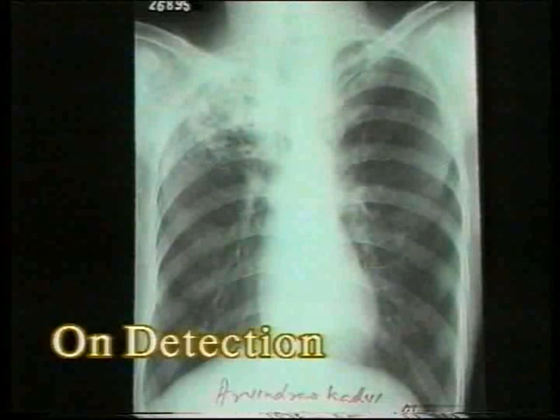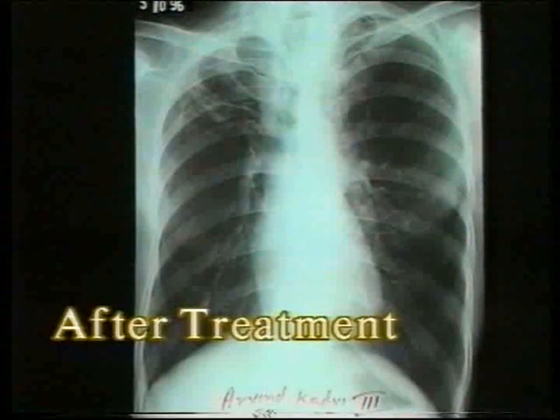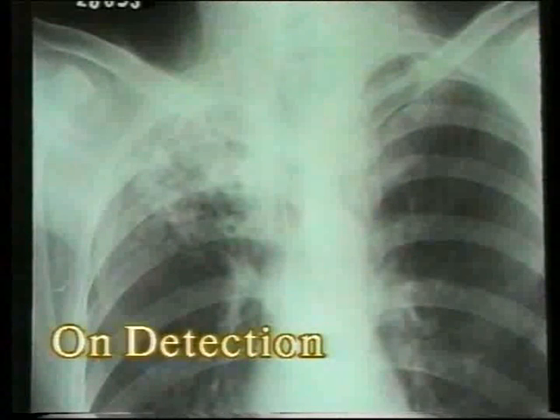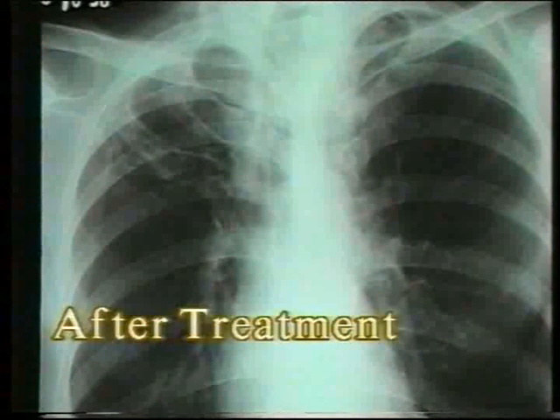This is another patient showing a dense infiltration in the right upper zone. The second X-ray after 1 year of chemotherapy shows complete healing with only a few fibrotic streaks in the upper zone. Let us view it in a close-up view. Note the dense infiltration involving the right apex. The second X-ray shows just a few thin fibrous streaks and slight shift of trachea towards the lesion indicating fibrosis.